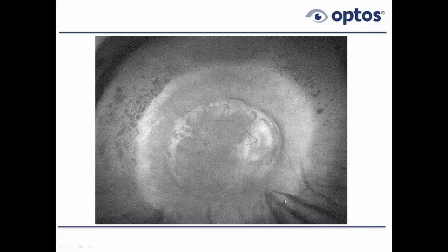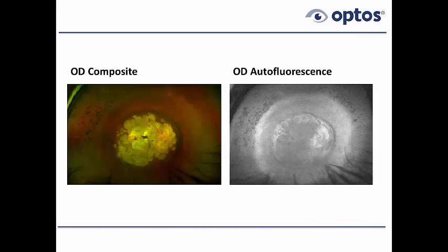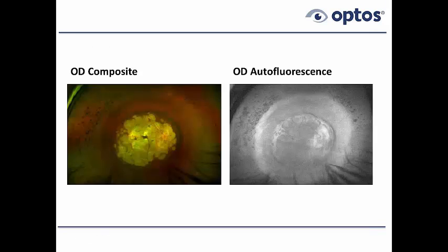So of interest, we are getting some rings, and we're getting some pigment. So this is not retinitis pigmentosa. This is just a pathological myopia that can mimic it to some extent because of the pigmentary changes in the periphery. However, typically not bone corpuscle, or not as many, not the highest percentage. And these rings over here actually correspond to staphylomas, where in the retinitis pigmentosa case, they're not truly related to stretching of the eye. And you wouldn't see them on, say, B-scan or even with depth with binocular indirect ophthalmoscopy. So the composite shown here and the autofluorescence shown there.